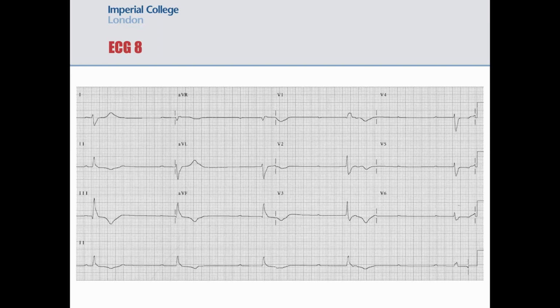The normal natural rhythm of the ventricles is very slow, and as you can see, the beats are very wide apart, probably about 10 large squares between them. So the ventricles are beating at 30 beats per minute.